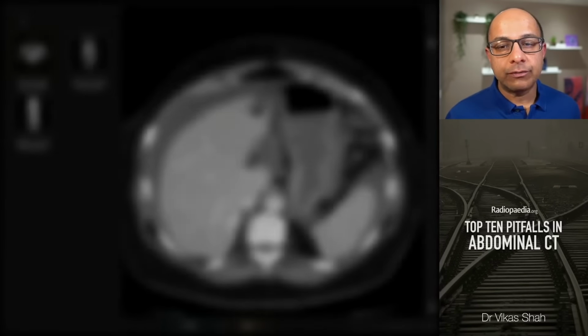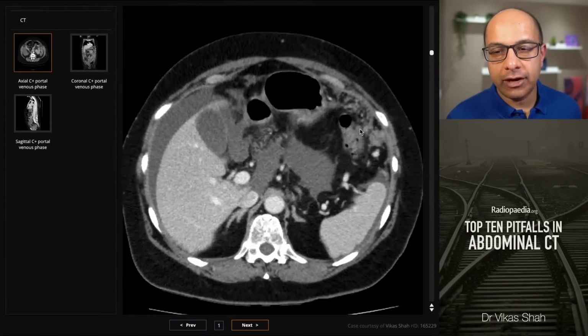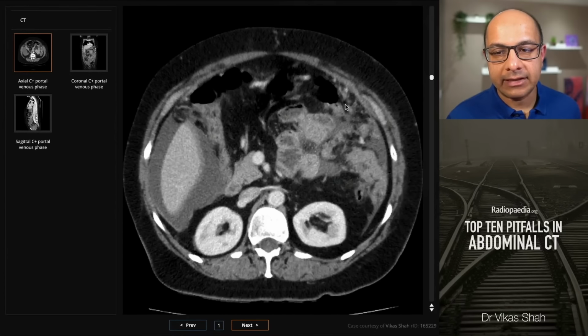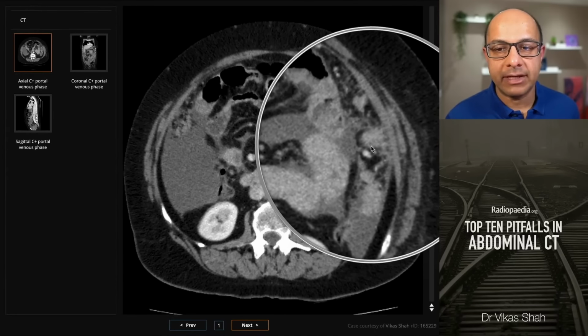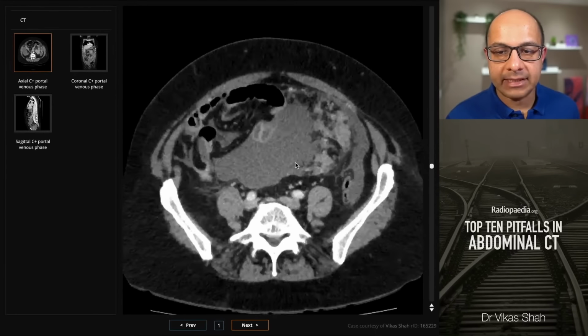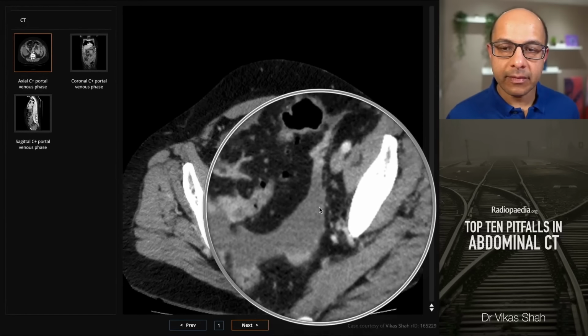So I'm going to show you two CT studies with patients with almost identical demographic data, both young women and both with abdominal discomfort. Here's the first one. We've got lots of ascites, and then as you scroll down, look at this nodular thickening of the omentum. And as we scroll down further, you see that it takes on a mass-like process, as these are nodular masses within the omentum. We still see lots of ascites, and then as we scroll down, we may see some abnormal thickening of the peritoneum in the pelvis.